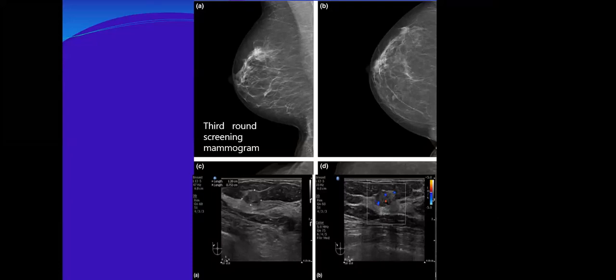It is not a clear cutting sign, but this is enough. Being heterogeneous and hypervascular, with moderate intralesional vascular signals and indistinct, irregular margins, is enough.